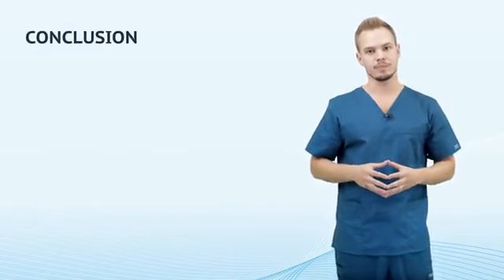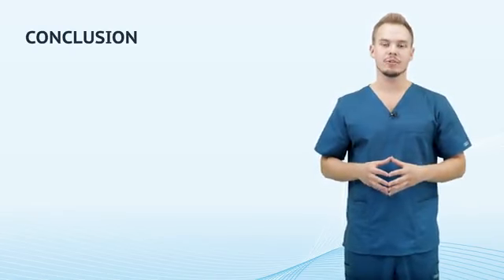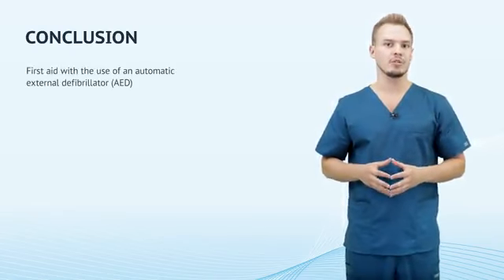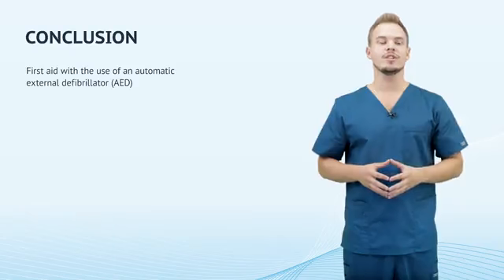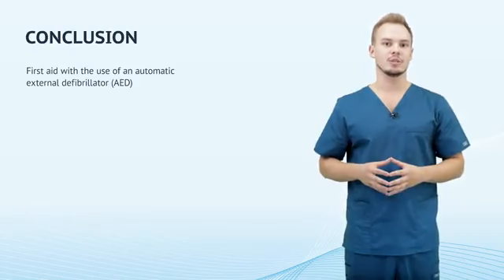To sum up, today you learned the algorithm of first aid with the use of an automatic external defibrillator for victims in the absence of consciousness and breathing. To consolidate the material, watch a video and see how the right action in case of sudden cardiac arrest will look.